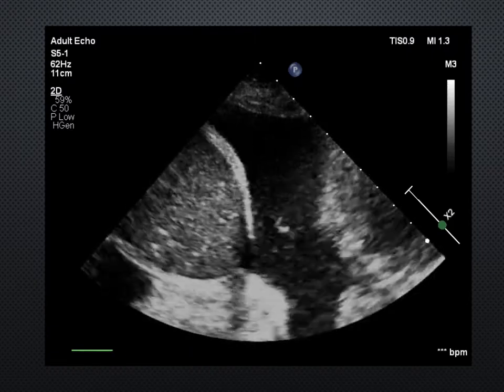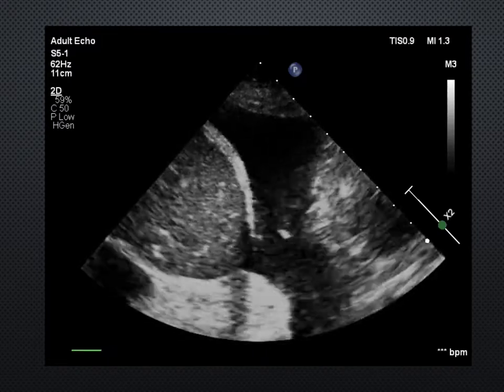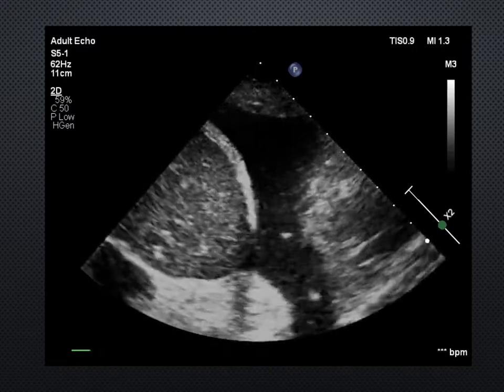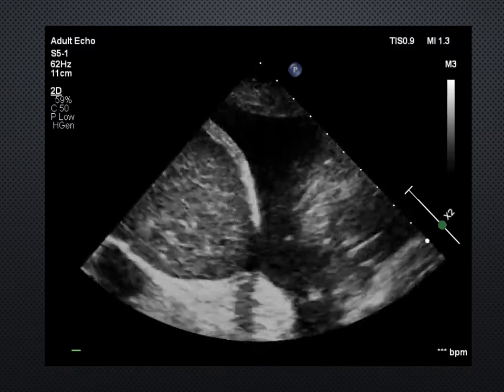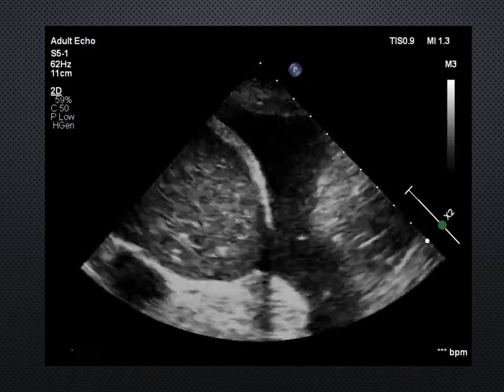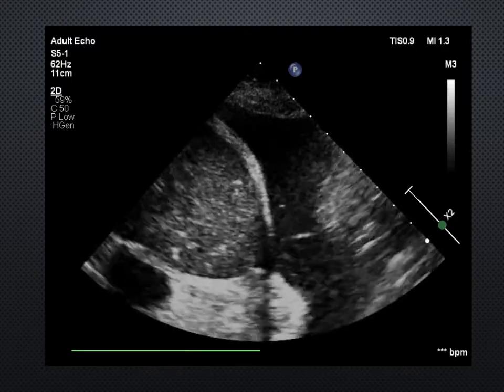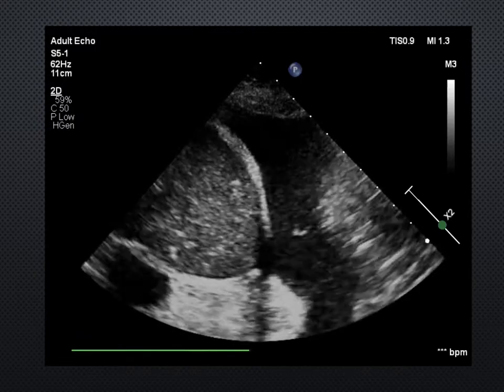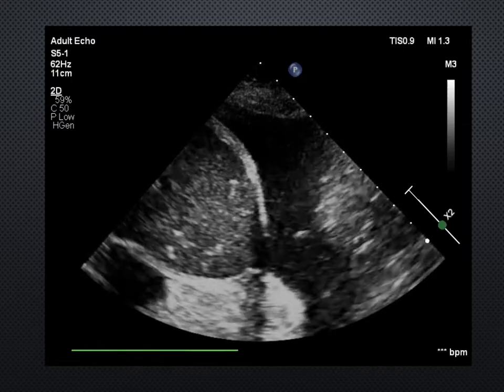Talking about the difference between our simple, our transudate, and our exudate types of fluids, you can see in this picture, although it's backwards because the pointer is the wrong way around, it's a phased array probe that we're looking at here. You can see that the fluid itself has got these particles in it, giving us some indication that there are some bigger particles within this fluid. Not knowing specifically what that is, that could be lung, that could be blood tissue, that could be infected tissue within that lung. But what we do know is that that fluid itself doesn't look to be very clean and very healthy. So definitely, again, draining it would probably be beneficial to the patient in the long term.